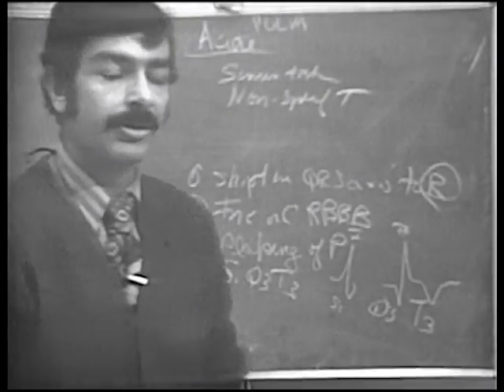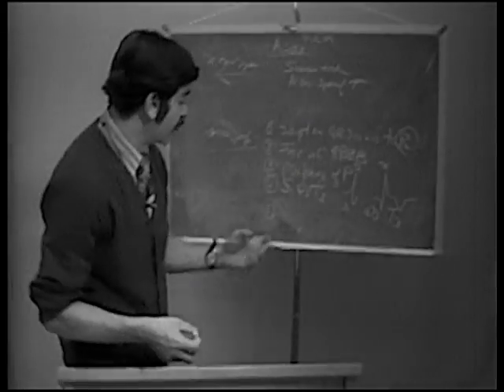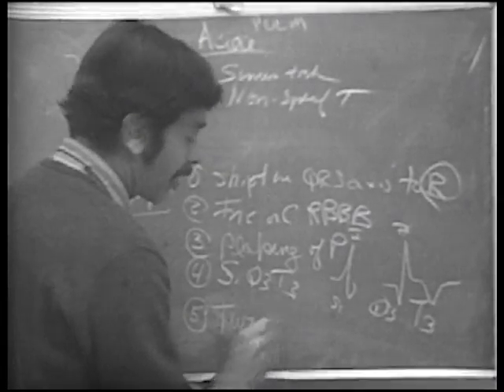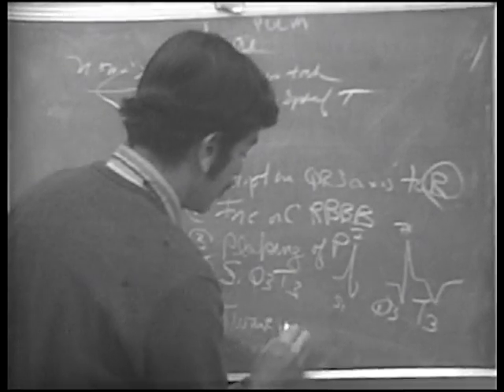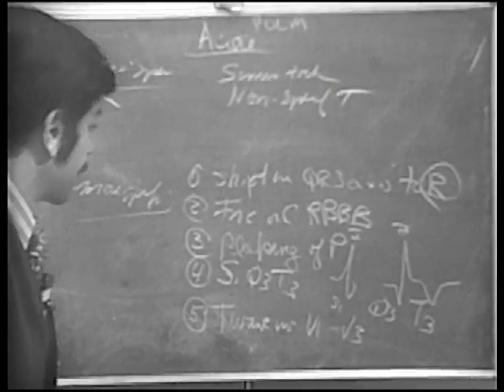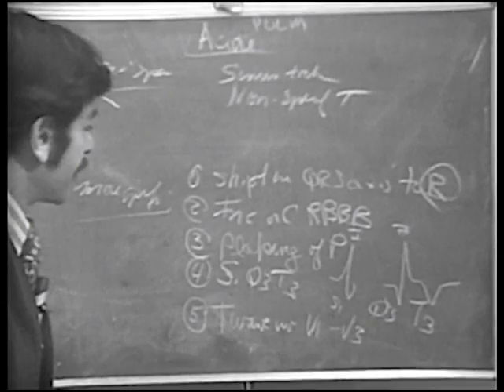But you might see signs of right ventricular overload or ischemia, and these are manifested by T-wave inversions in the right precordial leads, in the right ventricular leads. T-wave inversions V1 through V3, and maybe even further out. And sometimes these are also seen in the inferior leads.